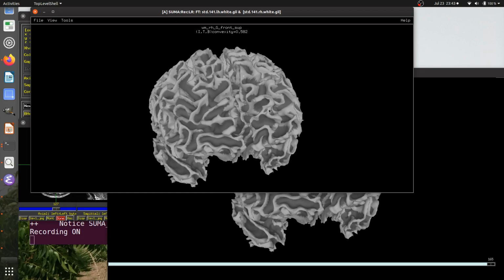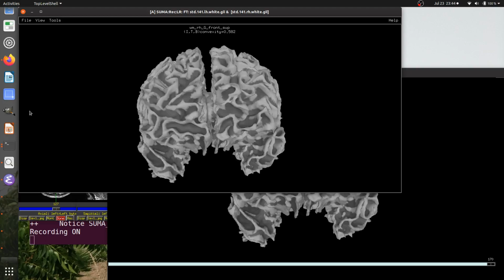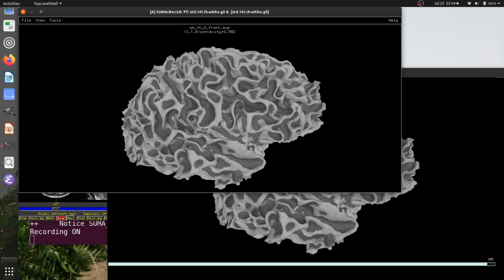Essentially, every time I change the SUMA viewer and how it looks, a new snapshot is made and added to the list. They'll get concatenated and turned into a movie. While I'm just talking, this number is not getting bigger, so this would not be a long pause in the video. It only records successive changes at a constant rate.